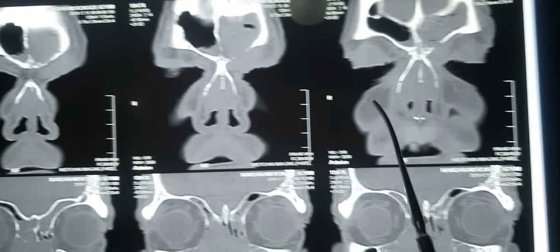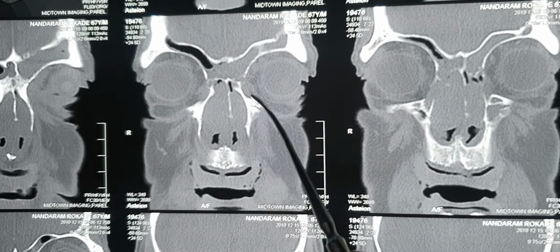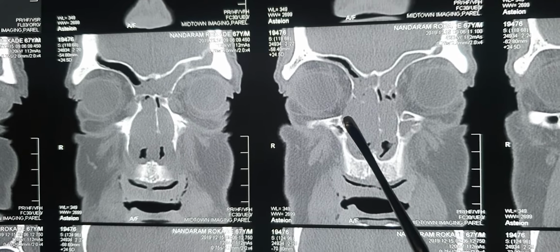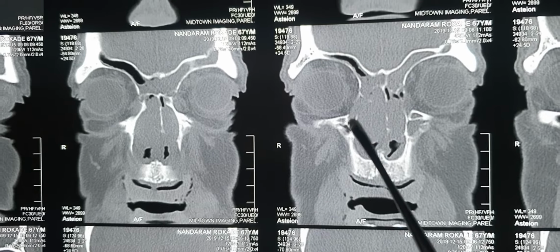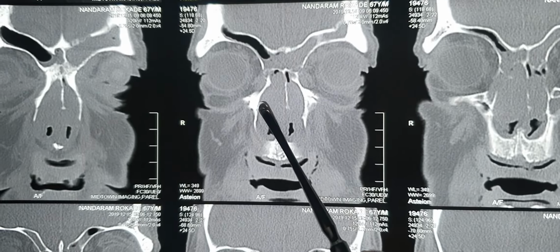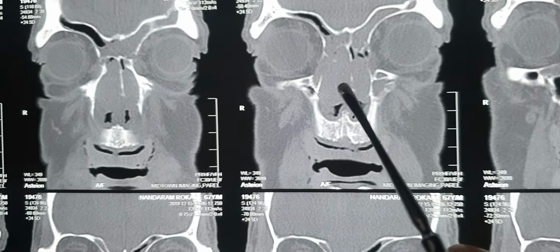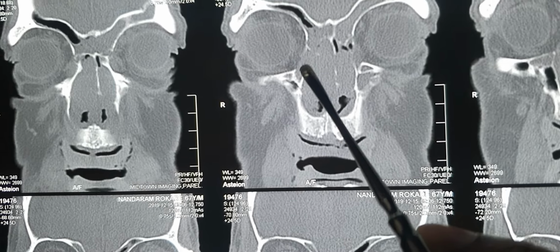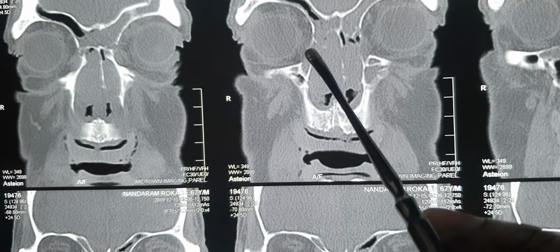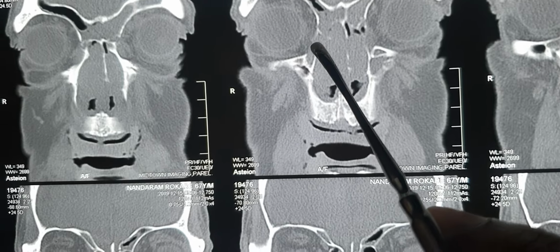Keep on following that, just keep on following that until you see a soft tissue opacification on the lateral aspect of it, posterior and lateral to the frontal process of the maxilla. So this was the posterior most region of the frontal process of the maxilla. Just posterior to it, you can see a vertical area of opacification. This is the area of the nasolacrimal duct system. Okay, so this is the nasolacrimal duct.